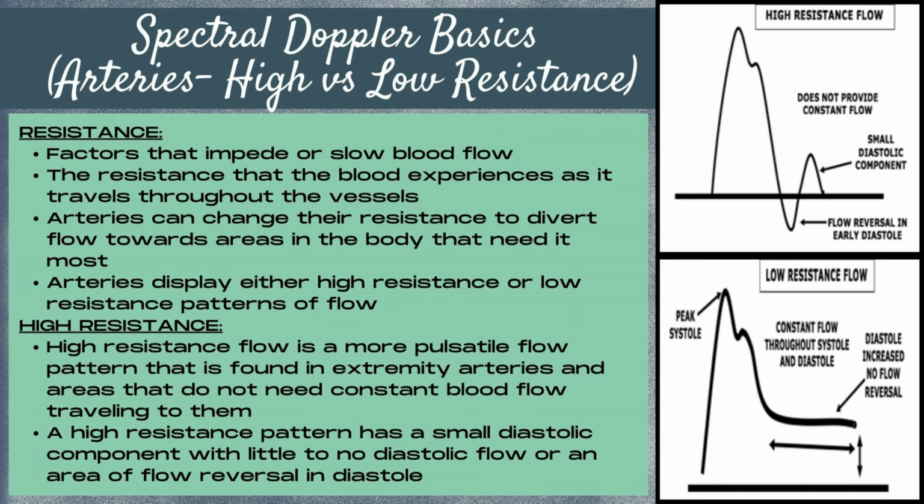Another crucial factor to understand when interpreting arterial spectral Doppler waveforms is resistance. Resistance refers to factors that impede or slow blood flow. It's the resistance that the blood experiences as it travels through the vessels. And arteries can change their resistance level to divert flow towards areas in the body that need it most. And on spectral Doppler waveform patterns, arteries will display either high resistance or low resistance patterns of flow, or mixed resistance patterns of flow.